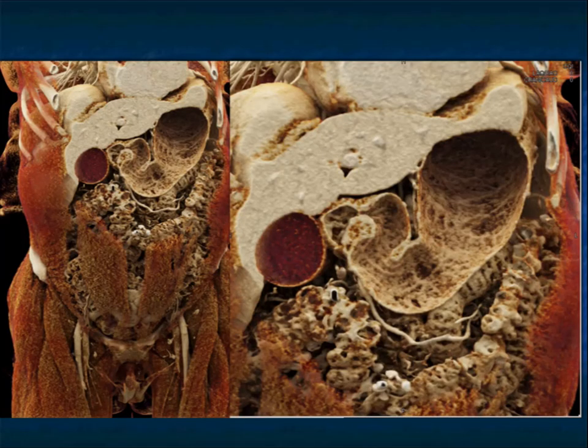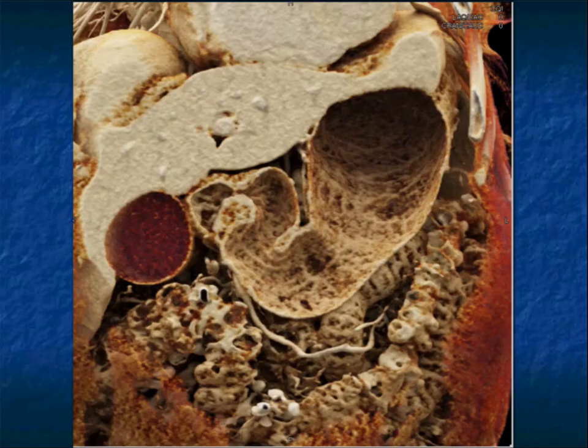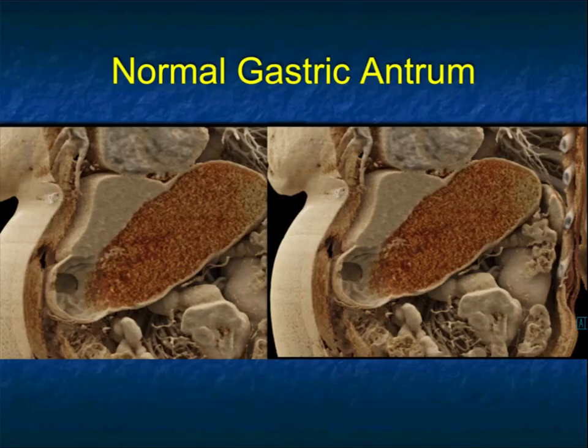We also note with newer techniques like cinematic rendering, if you could distend the stomach well, it's amazing the details you can get in terms of being able to look at the gastric folds. Whether it's distended with water or air, the key is distension. Take a look, you can see the red is water. Look down the gastric antrum.